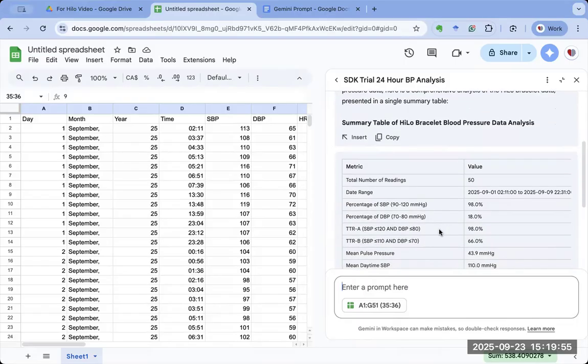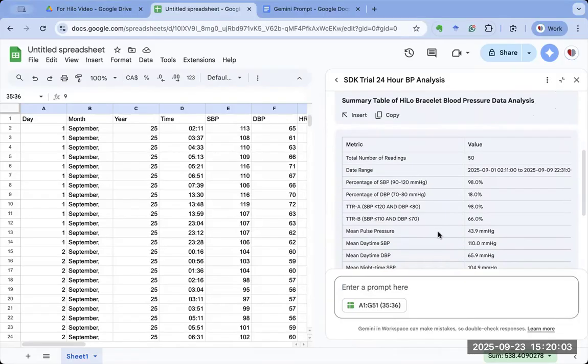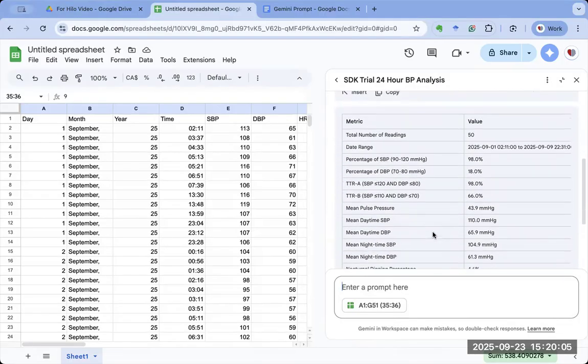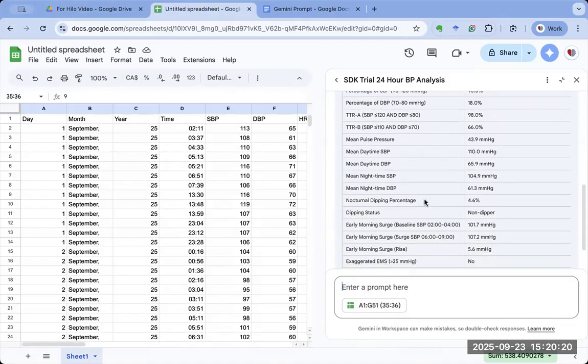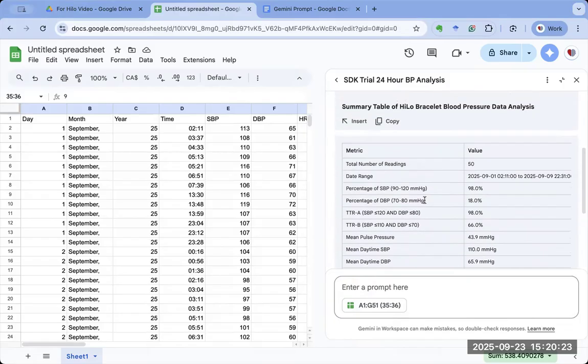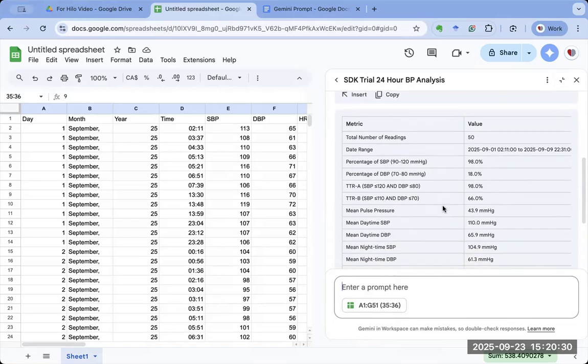And so what did I include in the prompt? Here you can see what are the different things it has. So this was, like I said, a copy pasted prompt, so I don't need to write a new prompt every time. And what are the different parameters I'm looking at? So this is the calculation that Gemini has done. And I do hope you can see it well. I want to make sure all of you can read this clearly.